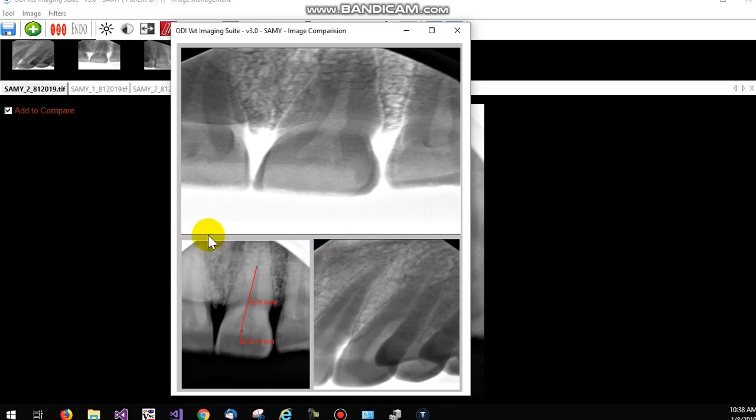You also have an option from here to preview or print. You can preview to see how it's going to look when it goes to the printer, or you can just give the print command. It will go to your default printer.